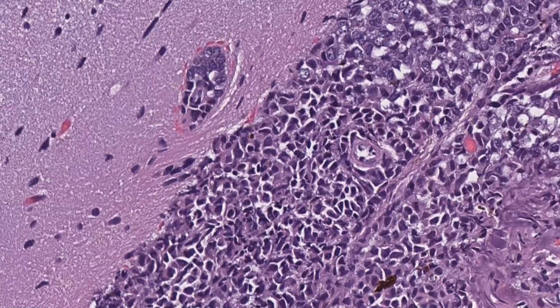New feature. See, we're building that 8-Venn diagram model of convergent evidence leading us to the correct diagnosis. What just showed up new? You could see it on the low power, but now it's obvious. What's the new feature here? All right, yes, Dr. Gilbert, infiltration of the Virchow-Robin perivascular space.